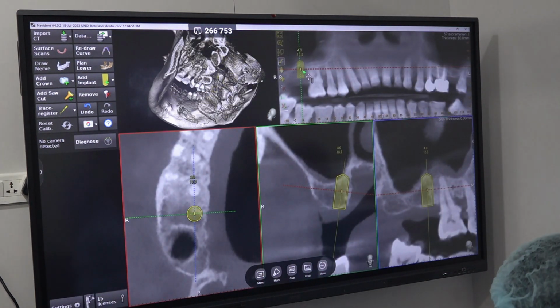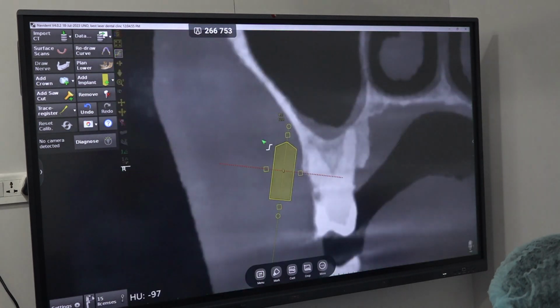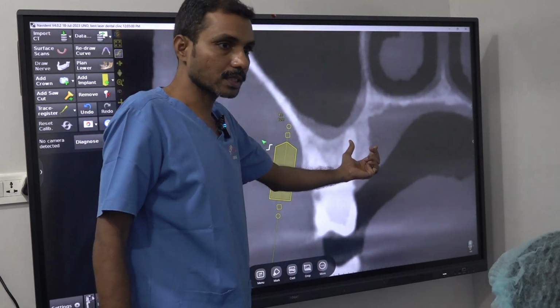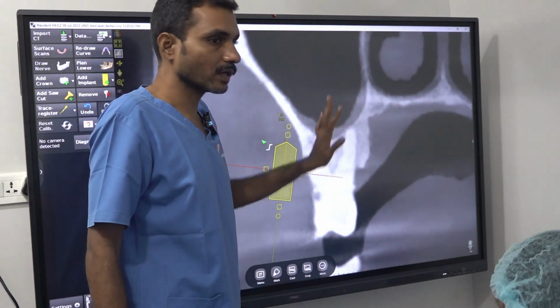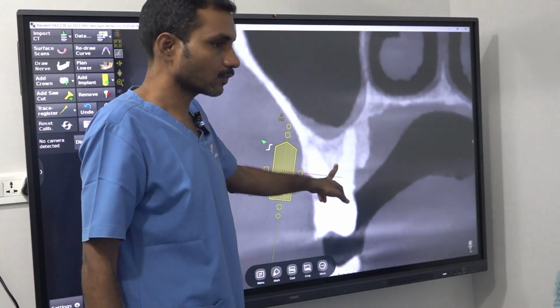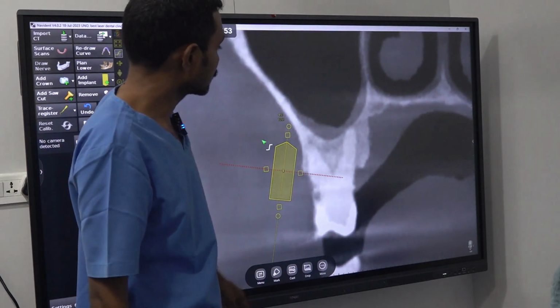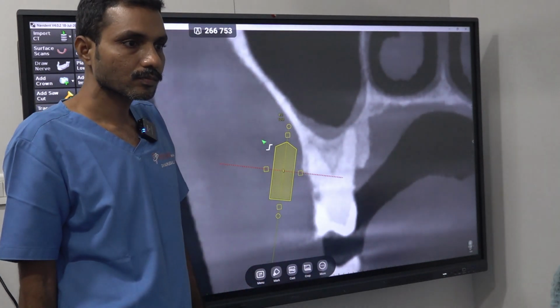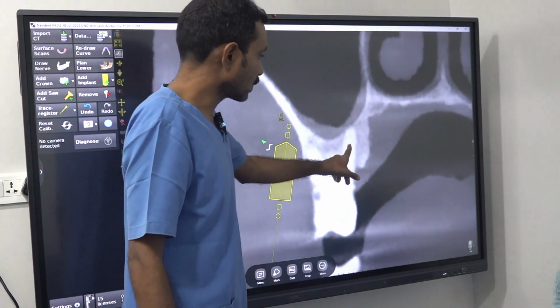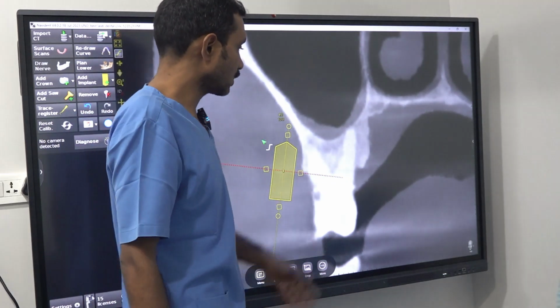Now we are checking the palatal root. Okay, palatal root. Palatal bone is present and thick. Yesterday we saw very thin bone. So this is very ideal for 5.5. Luckily, this interdental furcation bone is also present. Even buccal bone is also present, only till here it is missing. If we are giving 1 or 3 teeth, we can use 5.5, no problem. Yes, only for single tooth. You cannot put one single implant here and put one molar. So 5.5, 10 or 12, whatever it is.